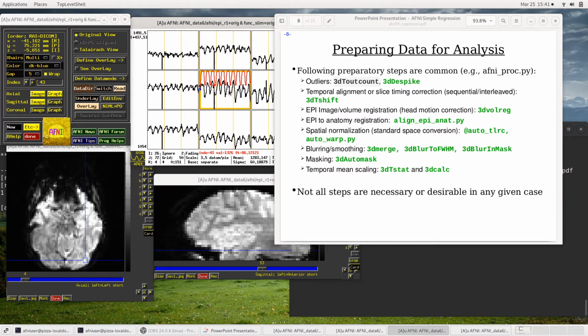It counts these in terms of median absolute deviation: for every time point it gets the absolute deviation from that trend, and then how many median deviations you are at each time point. If you're too many, like clearly this spike is, the trend might put you up here, but this is way down here, the program will say that's a spike.